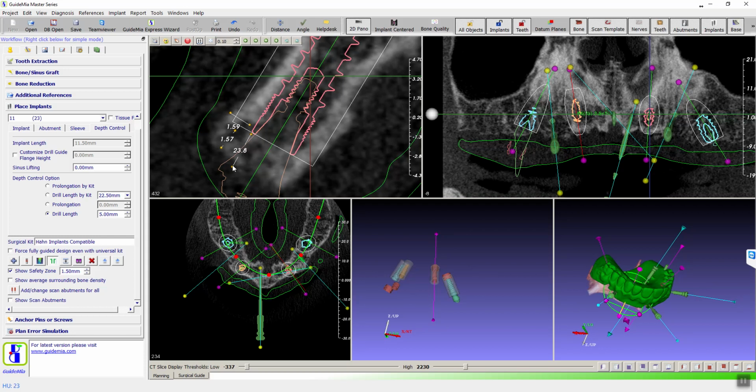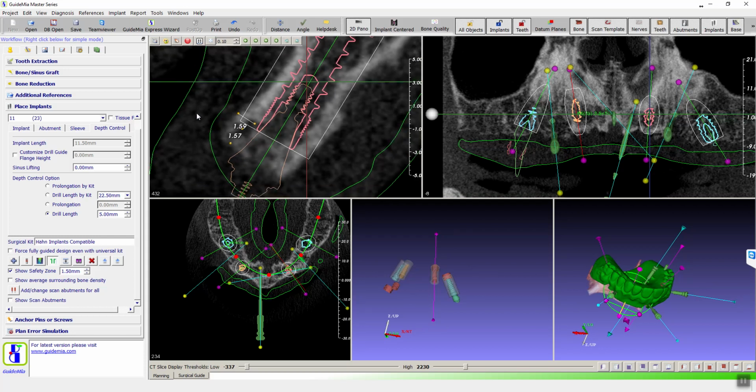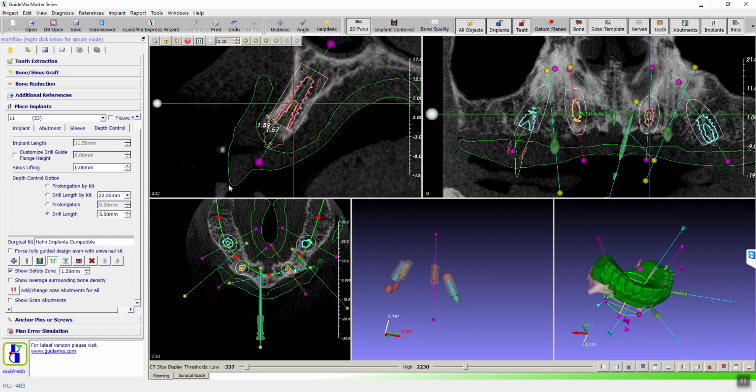You want to go all the way? So that surgical guide will be what the teeth look like in the end. So you have to zoom out. There you go. Oh, you want to go all the way to this spot? Yeah. Okay. So, let me see. That's actually what Dr. Manalili wants to see, especially in the anterior. So for this case, 16 millimeters, that's probably too much. Nope, that's actually just about right.